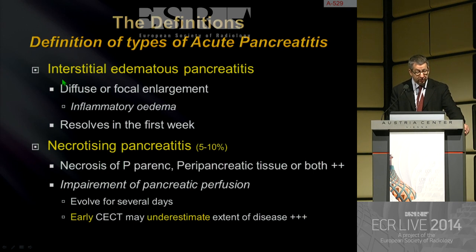So interstitial edematous pancreatitis will be seen with inflammatory edema that will cause diffuse or focal enlargement of the pancreatic gland, the so-called type B of the Balthazar classification at CT, and in most cases, it will resolve in the first week.